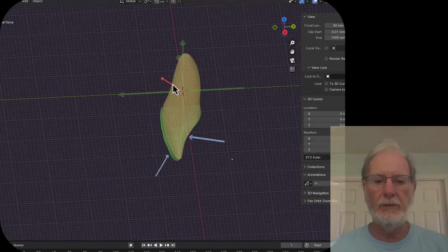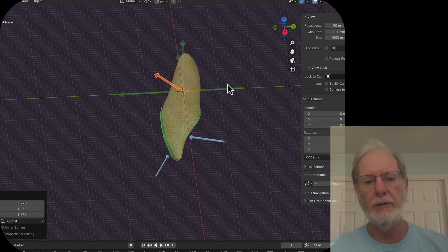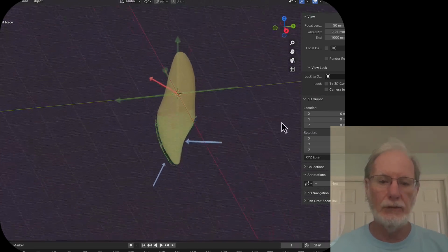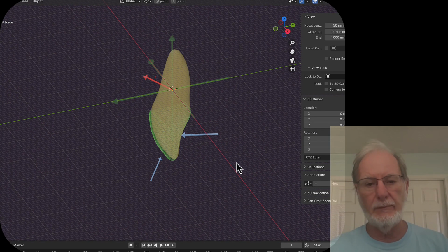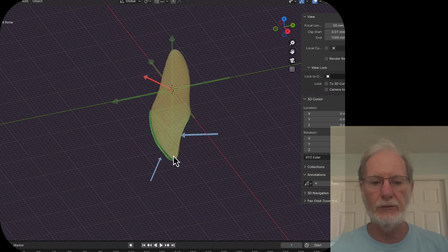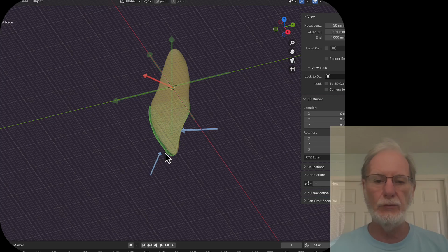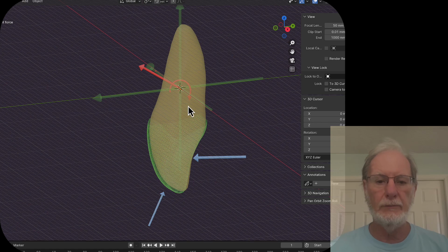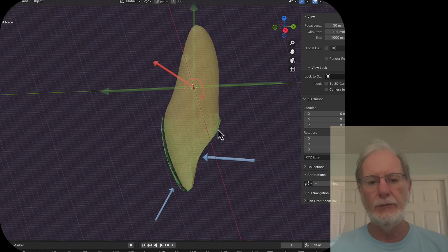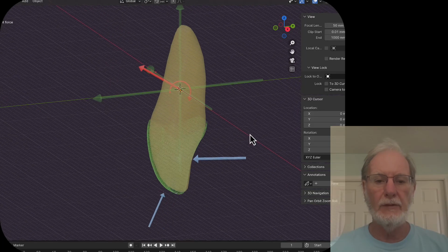So this is roughly the amplitude. You may argue that it could be a little bit larger. So let's make it this way. So it's a bit larger. So that's the translation aspect of the force system. Because this force and this force are away from the center of resistance, you also will introduce a moment, which will be rotating the tooth, slightly turning it sideways because it's not exactly in the 3 planes of space.